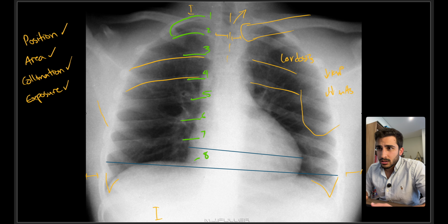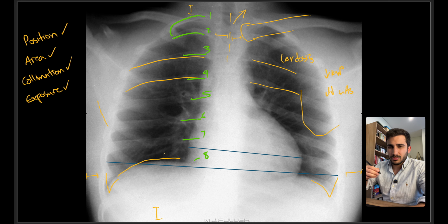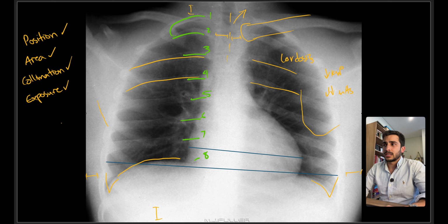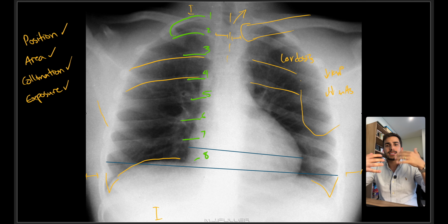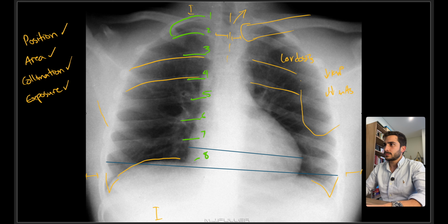If you couldn't see the diaphragm very clearly and it was kind of blurred, you can see a double line. Maybe you could make the argument that the seconds in the mAs was quite high, or the patient didn't stop breathing in time. So the mAs, you could adjust the mA and the seconds portion separately and bring the seconds down but increase the mA. But either way, the mAs is quite low on this one. And so exposure could definitely be improved.